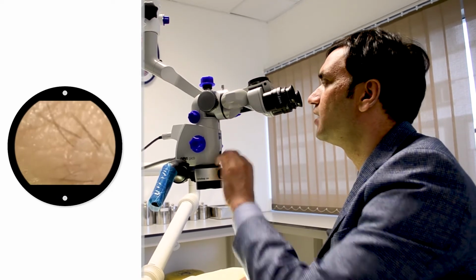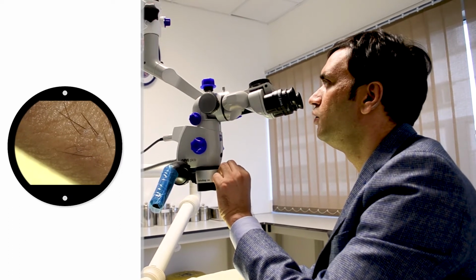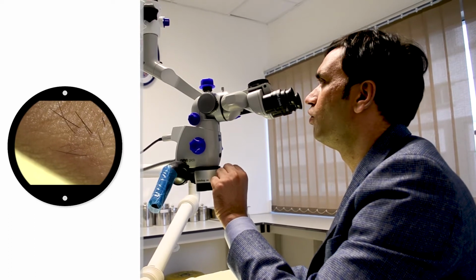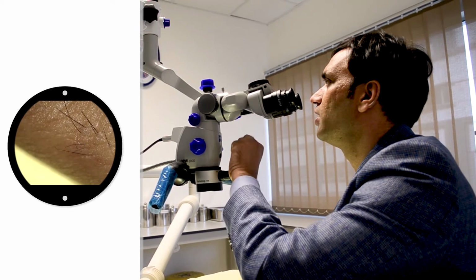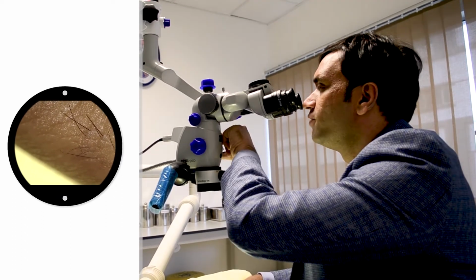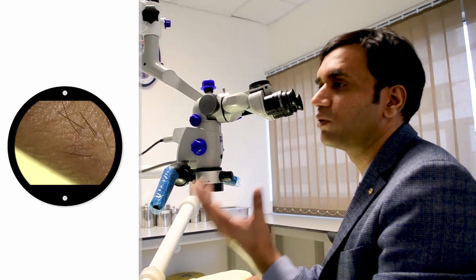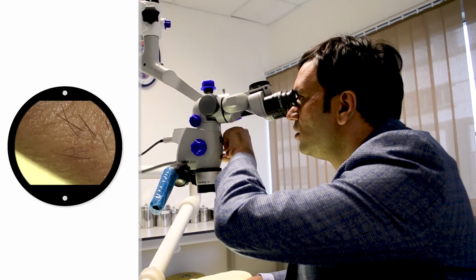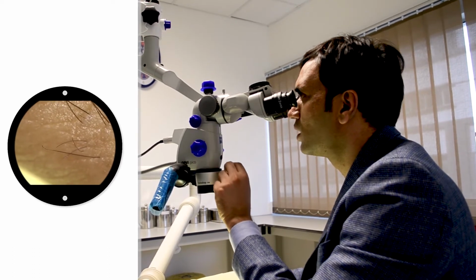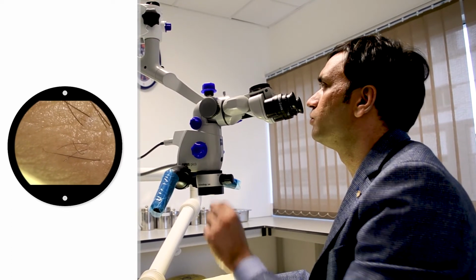Let me move to 1.6 first, so that you all can appreciate 2.5. You can see still my folds or creases of my skin, and also the hair follicles. You can see that they are going in different directions. Or if you want to appreciate very, very minor details of what we do in our root canal treatment, you can see that I move to 2.5. You can see so clearly the hair follicles. You can even see the smallest of hair follicles possible.